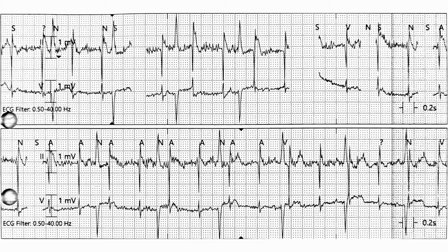Both of these populations of QRS complexes have their own rate, and they seem to be not affecting each other. So if I look at this rate as the interval between wider QRS to next wide QRS, and this interval as the narrower QRS to the other narrower QRS, they're kind of walking through each other and not influencing each other at all. So you can see from the wide to the narrow beat here, this interval shortens, and here they're completely over top of one another, and they don't seem to influence one another at all.